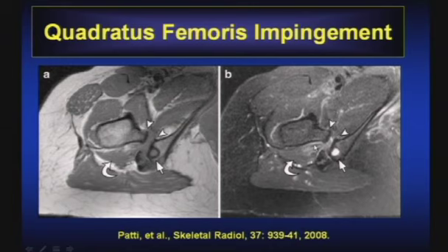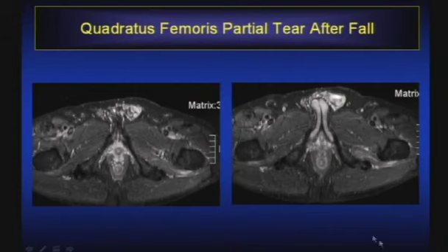Now, you can imagine that it would be very difficult if they didn't have all these other findings to distinguish the presence of edema here from a partial tear. We also are going with the clinical history, a chronic repetitive microtrauma type phenomenon. Right? So in these cases, the secondary findings help you narrow your diagnosis as to the distinction of etiology. Okay? And remember, if you're thinking about impingement, again, these are clinical diagnoses.